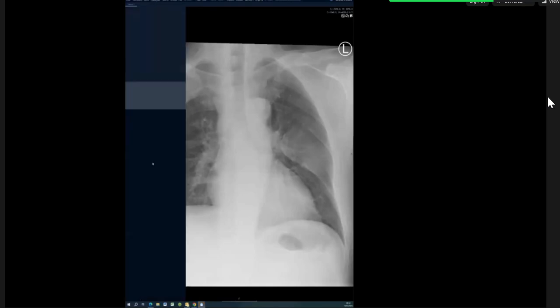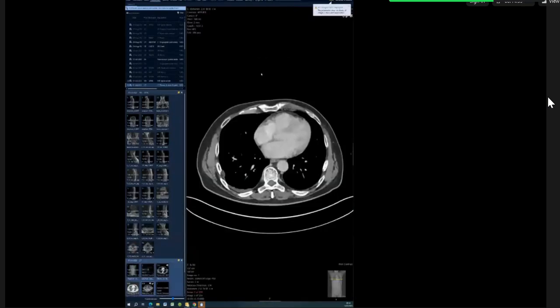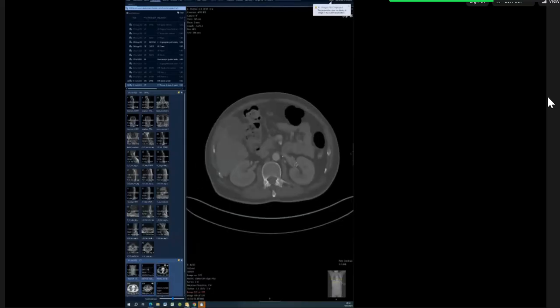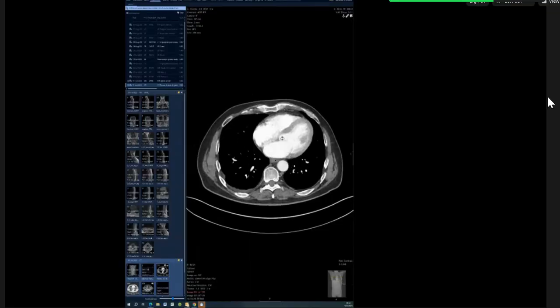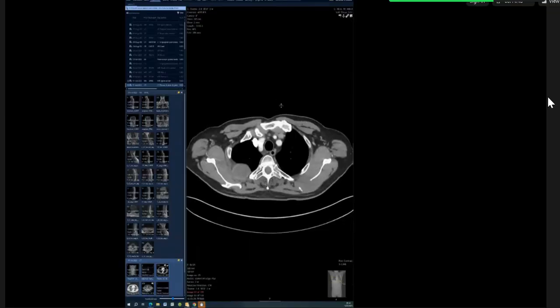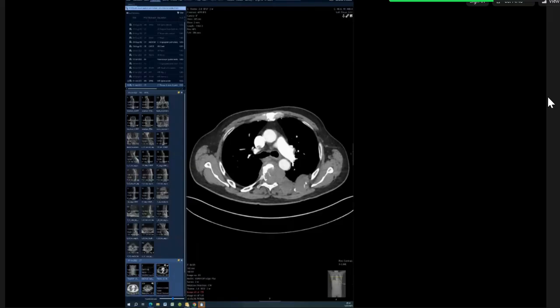In terms of safety, the RCC was right at the edge of the chest, so that was the one completing it all. Expansile bone mets with a left renal lesion suggestive of renal cell primary. And you have to always think of the spine, because you always want to not miss the thing that keeps the patient safe. Don't want to make a mistake like that and get everything right and miss the spine bit. Yeah. Because that makes it hard to then give you a high score on an otherwise good case. Very well done. I will give you a harder one.